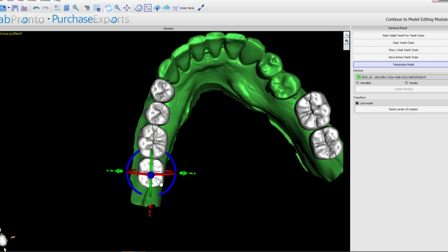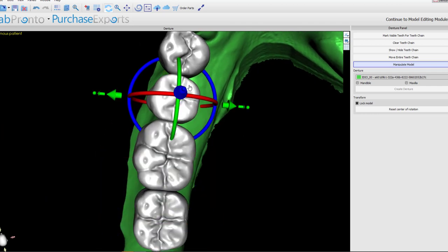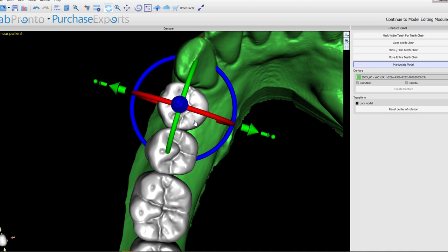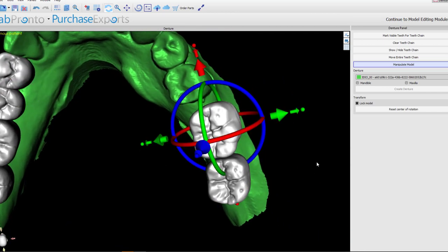All right, that's looking good. I'm also going to create just the slightest bit of impingement of these teeth into one another, just because I only want to print these as one piece. I don't want to mess with having individual teeth to deal with when I do the bonding process. And then let's do this other side.